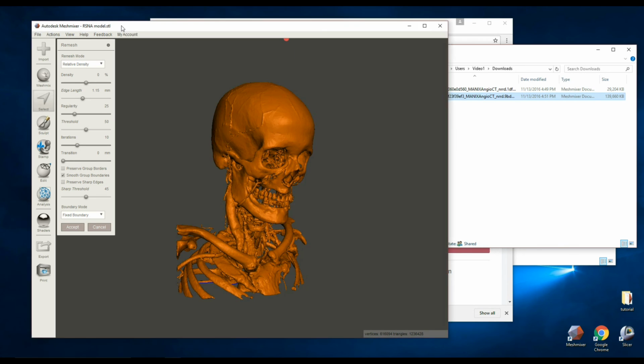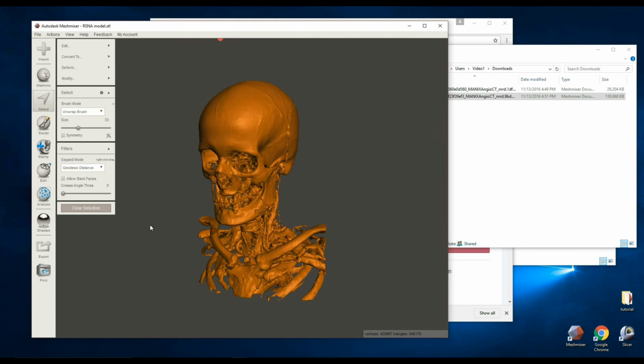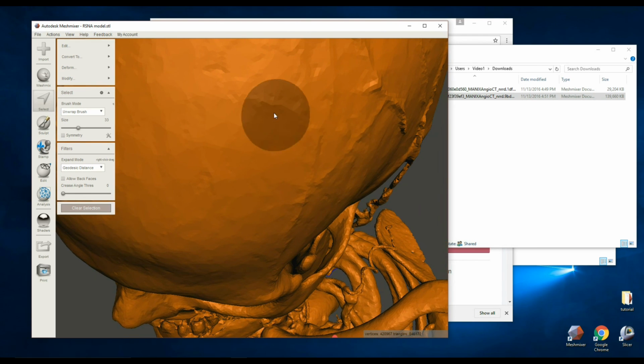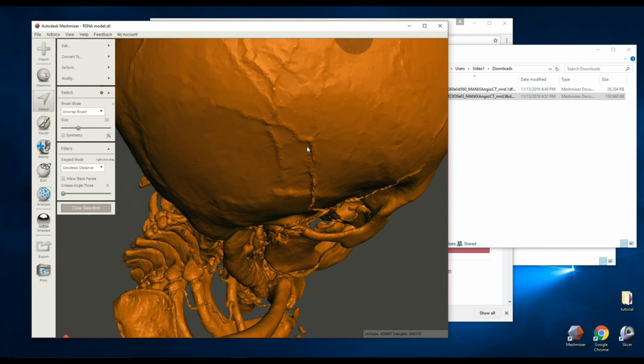Let's see how Meshmixer is doing. It looks like Meshmixer is now done with its remesh. So we'll click accept. Come on, Meshmixer. All right. Well, nope, still working. Okay, so here we go. And okay, so we've remeshed it, and you can see that the polygons are a lot more evenly distributed now. It doesn't look like that crinkled paper kind of appearance as much.